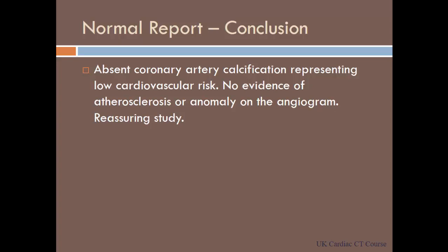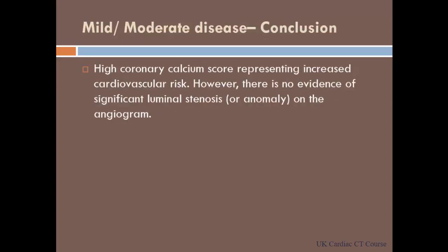Yeah. Reassuring study. The other type of report would be where the patient has a high calcium score: high calcium score presenting increased cardiovascular risk. So I always emphasize the risk from the calcium score itself. However, there is no evidence of significant luminal stenosis on the angiogram.